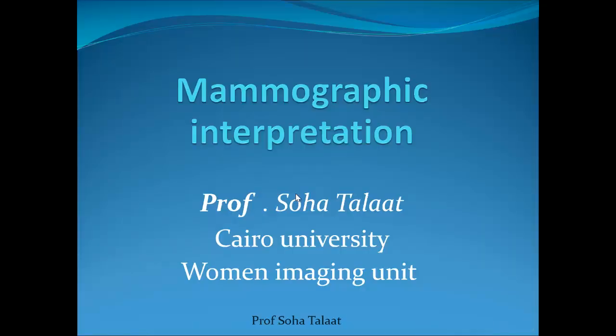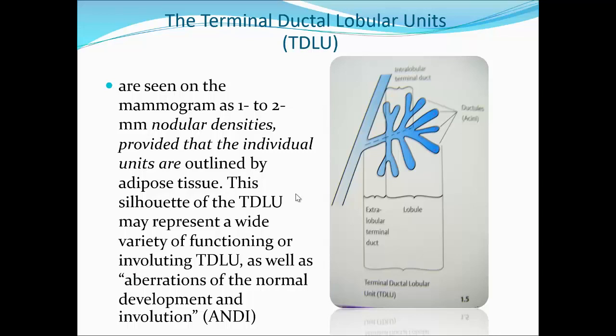Regarding mammographic interpretation, we have first to know the composition of the breast. Whenever one first sees the mammographic image, we'll see that it's all about linear strands inside. But what is the detailed examination of these findings and how we see it on mammogram?